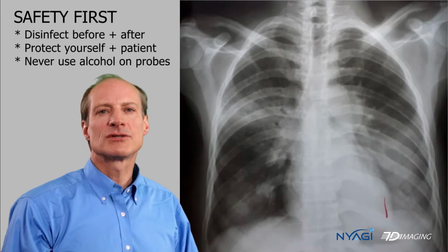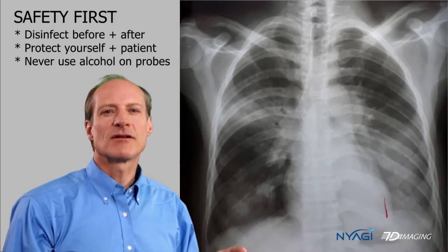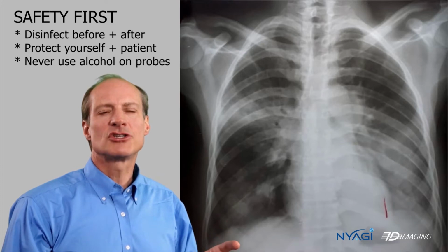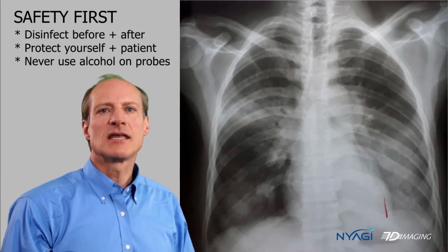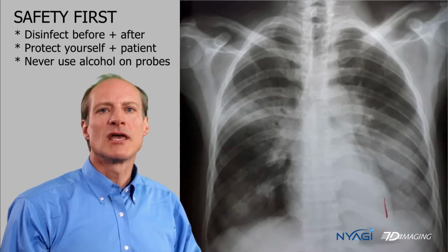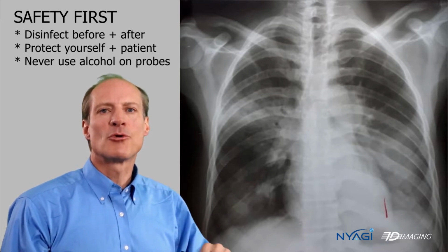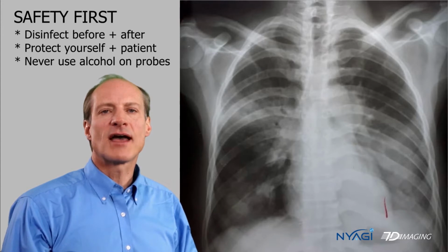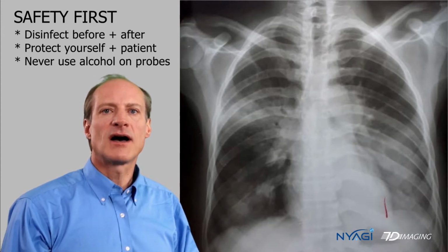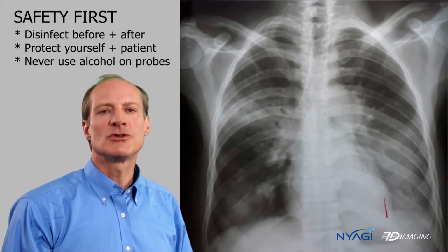And first and foremost, remember, don't spread the virus. Protect yourself and the patient. Disinfect the machine before and after use, and never use alcohol on the probes. Alcohol will destroy or ruin the probe face. Refer to the manufacturer's website or manual to define what type of cleaning agent you should use on the probes.